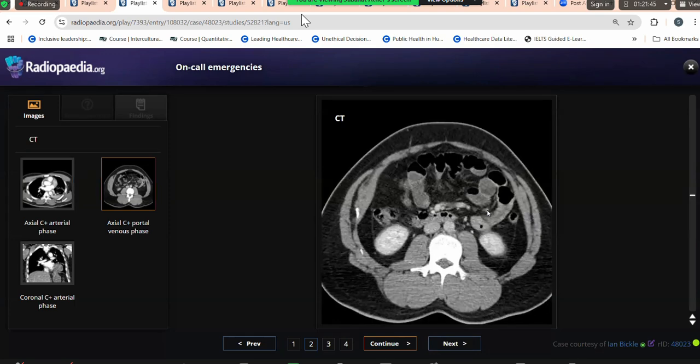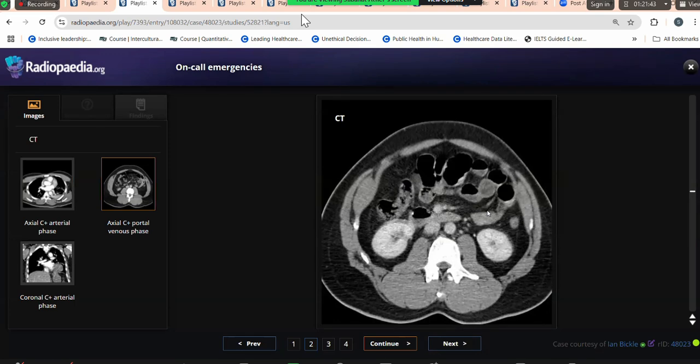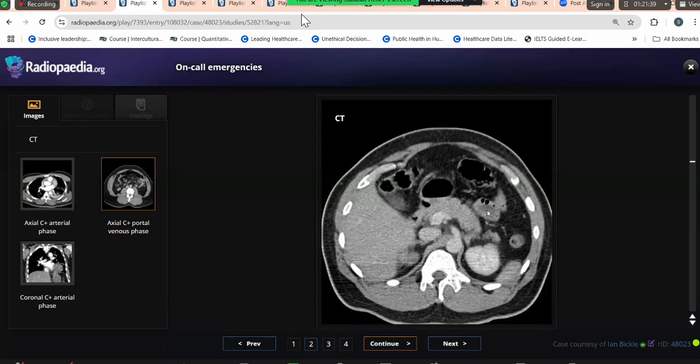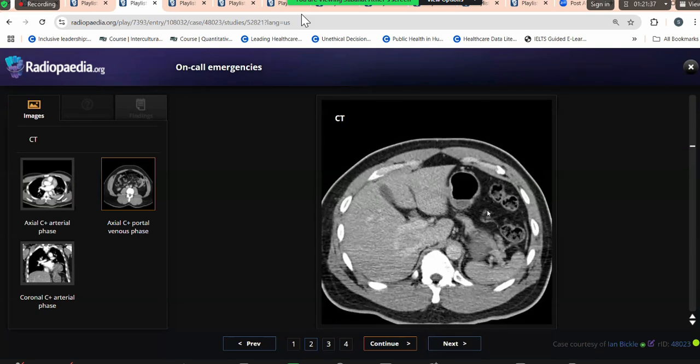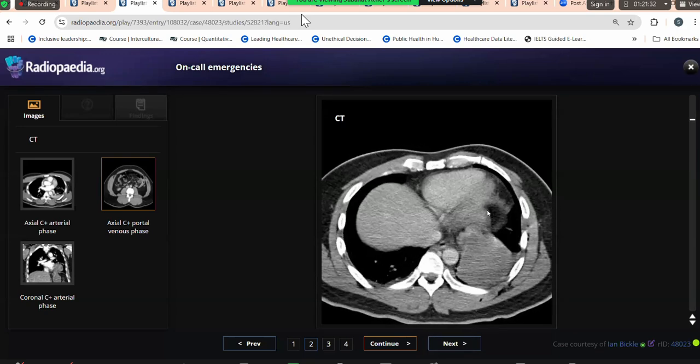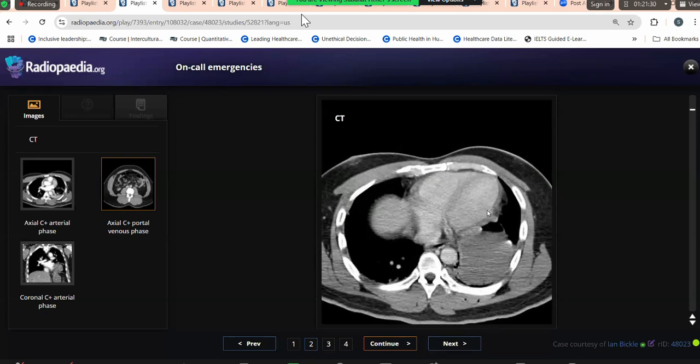Okay, ma'am. Should I limit to the chest, or include the abdomen as well? I think you want the abdomen. Okay, ma'am. So this is the portovenous phase of the same patient. I would like to scroll to the top to see that fluid density area.